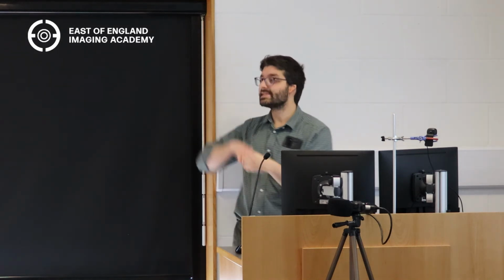Okay, now in terms of appearance, lymphomas usually don't look necrotic unless they're incredibly high grade. They usually look fairly solid. So the appearance can also help you to guide your thoughts. Okay, so this is probably not a lymphoma. Any other thoughts?